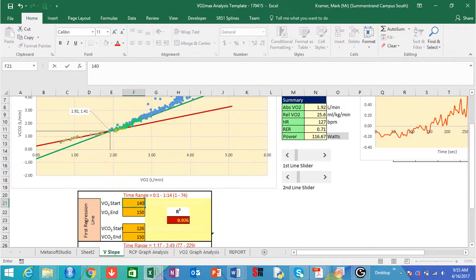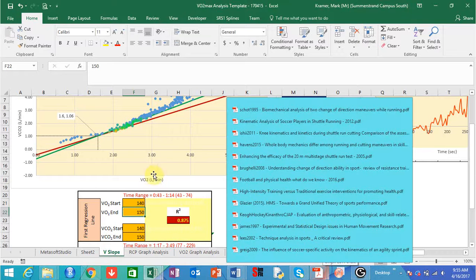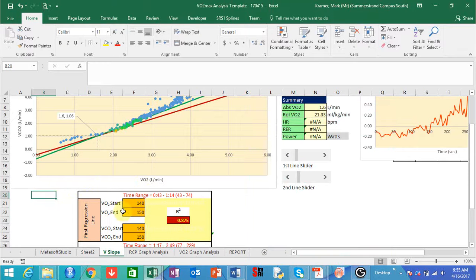and shift this up to 140, and then take it up to about 180. Remember, this is looking at the rows in the raw data. So now the time over which it's analyzing that is between 43 seconds and 2 minutes and 53 seconds. And again, that's quite low down. We can see if you look at all these data points, they accumulate relatively linearly, and then beyond that over here there seems to be a bit of an inflection point. So I'll include some more data in that.